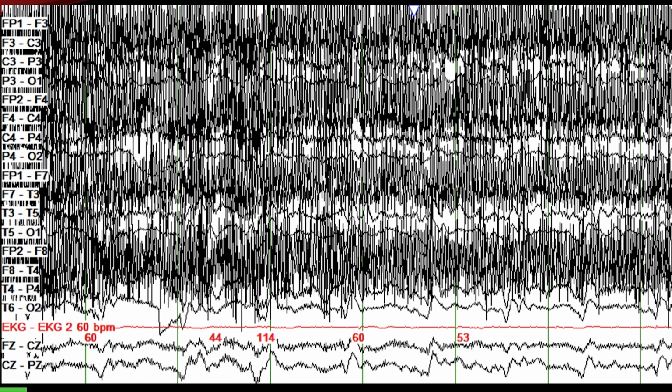Patients with CJD often are confused and disoriented. They are very fidgety and may be restless, and therefore when you record an EEG, the recording will be suboptimal. You will see a lot of muscle artifact as we see on this slide. A key thing is making certain that you look at the EEG using appropriate filters.